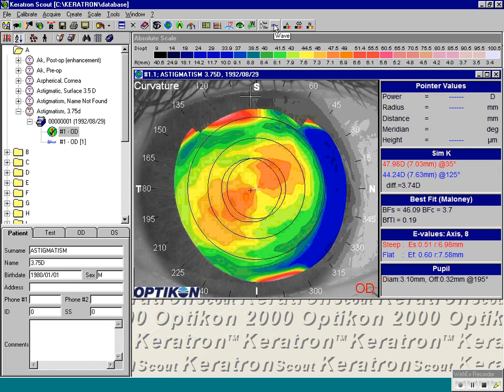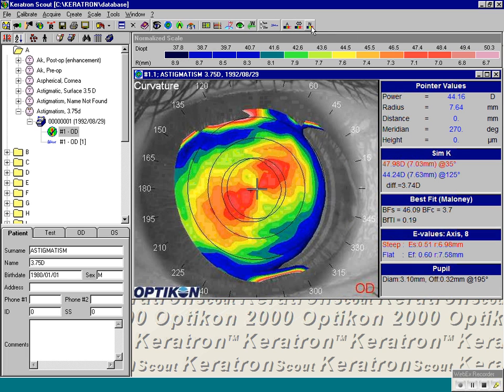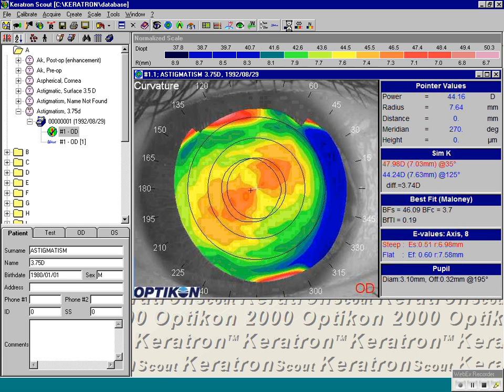And the wave icon is right here. If you have an extrapolated image up, or you have an extrapolated image already saved, you can click wave, and if you select that image, it will start the wave program. This section is the scale references. The system defaults to the absolute scale. So if you have gone to an adjustable scale or a normalized scale, you can always go back to the absolute, which is the scale of reference for most tests. The adjustable scale is used primarily by researchers or study groups looking for specific shape types.